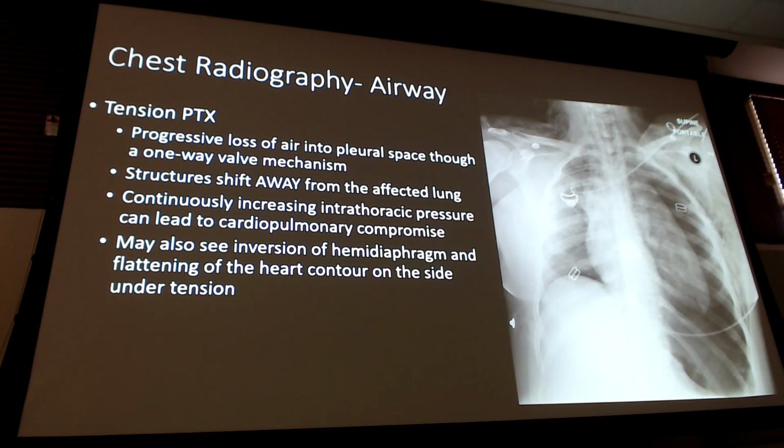So the key thing on this, again, is shifting the structures away. We have the pneumothorax. I don't need vitals to determine that it's tension because I have the shift. But if I didn't have a shift, vitals would tell me simple versus tension. This poor little lung.